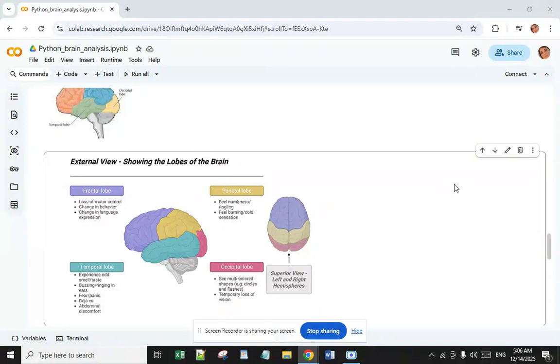The next approach or solution is introduction tutorial to fMRI decoding or functional MRI. Learn to perform decoding, in which Nilearn reproduces the Haxby 2001 study on a face versus cat discrimination task in a mask of the ventral stream.